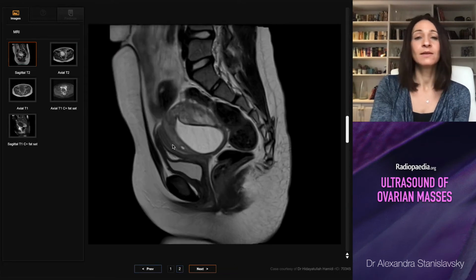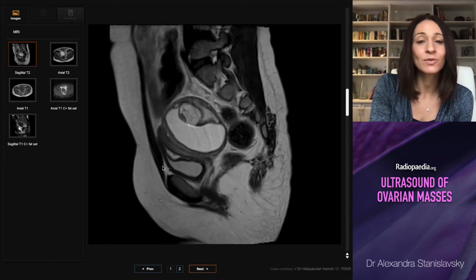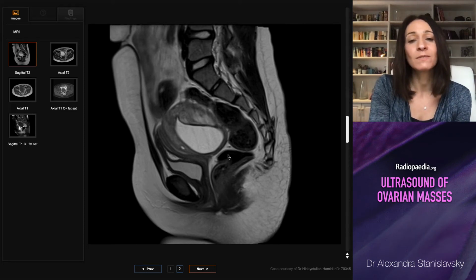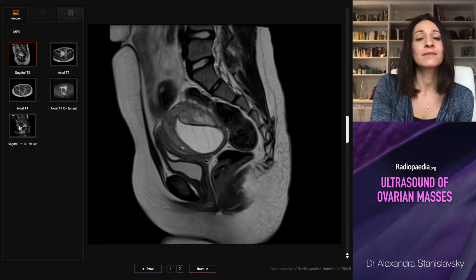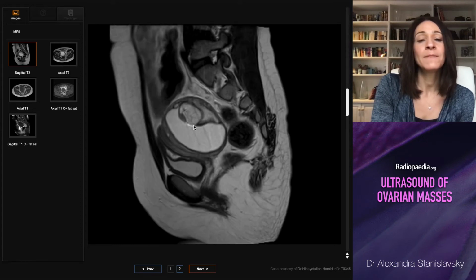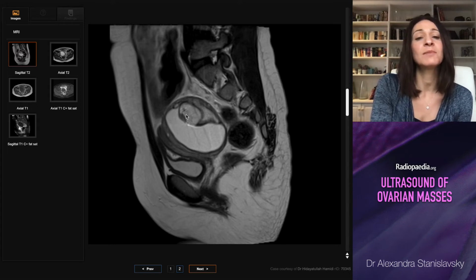And in cases like this, often we do go to MRI, and of course, although this is predominantly an ultrasound-based talk, this is MRI of the same lesion, and straight away, everything is so much more straightforward. So we see there's obviously a definite mass, and here's our bladder. There's the uterus all squashed up here, and this mass is sitting right behind the uterus, and it's got various different components. It's got this T2 hyperintense homogeneous component here. It's got another component which looks T2 hyperintense, but not quite the same. It looks a bit dirty. Maybe there's a few really thin septations in it, and there's some other tissue around it.